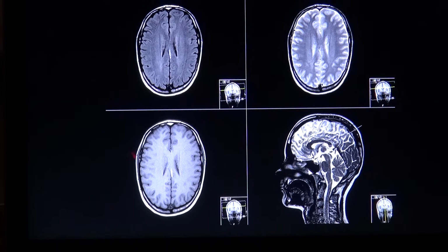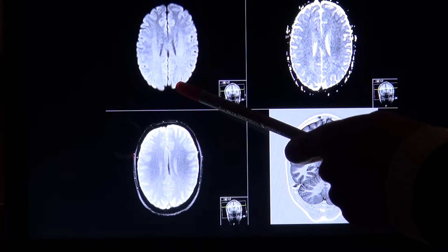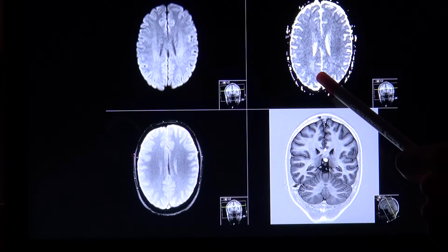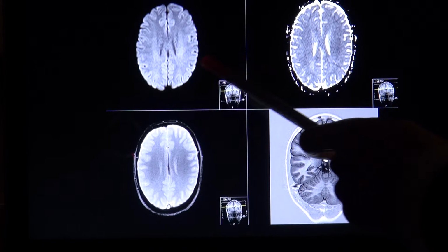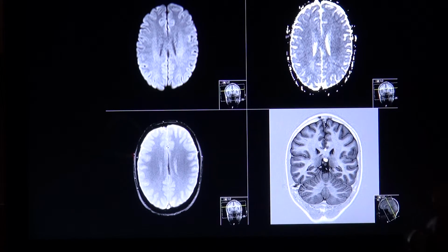After application of contrast agents, there is usually no enhancement. In CT, you will find fat equivalent densities of -50 to -100 Hounsfield units. The tubular-nodular form might show calcifications. This is a B1000 image with a corresponding ADC map where you don't see any diffusion restriction.